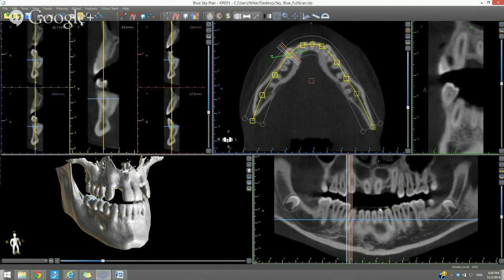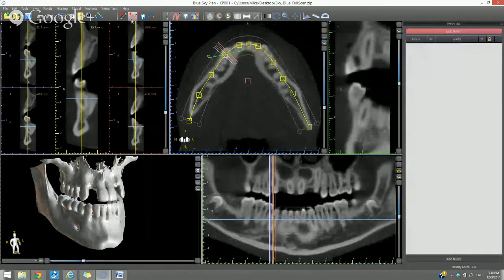Another component that we're going to see pop up when we start drawing our nerve, which is why I'm discussing it now, is that the software has panels. When we press the Add Nerve button, we see the nerve panel open up on the right side. The panels you could think of as a control panel for a particular functionality. When you start using a particular function, its panel will show up automatically. You can also open different panels by double-clicking on relevant items. For example, double-clicking on the 3D view will open up your surfaces panel.